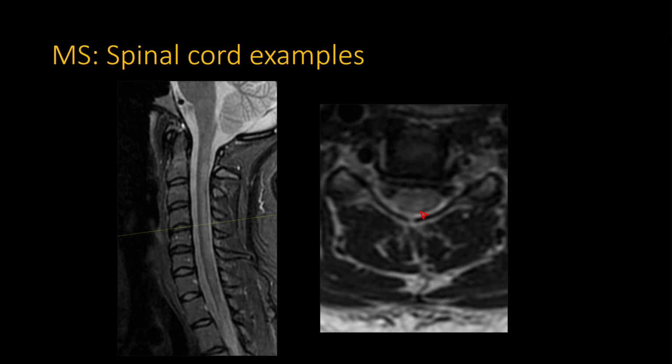Again, it's hard to say at first, if you see it for the first time, whether it's really a longitudinal extensive lesion versus a conglomerate of small peripheral lesions. Something like this will be very hard to say is not a true longitudinal extensive lesion, but MS, especially when it's end stage and long standing, can sometimes progress to that true longitudinal extensive cord hyperintensity that you can see in other things like NMO, for instance. But again, not very typical, especially when you only have a few lesions.